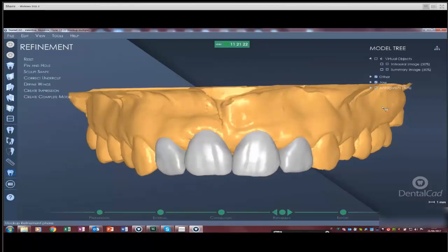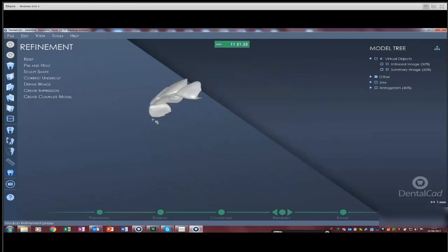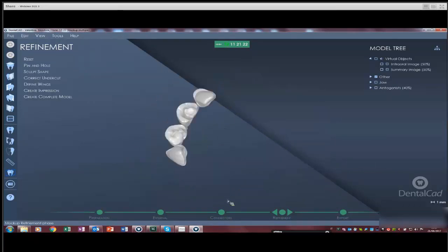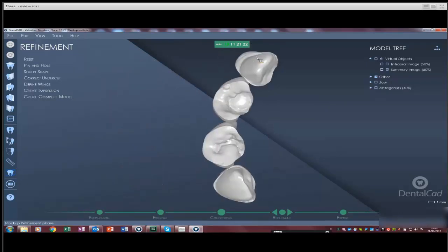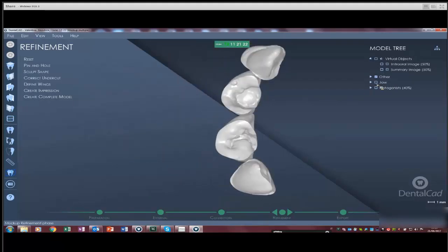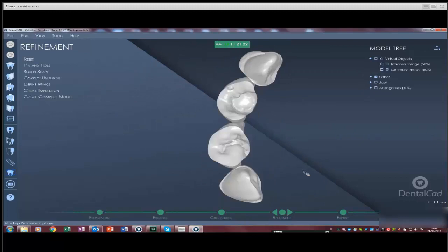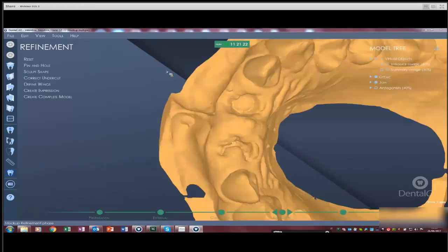And let me please show you what happened here. I turn off the jaw. Okay. Can you see it? So, what we have here are empty crowns for the laterals because we had the crowns here.